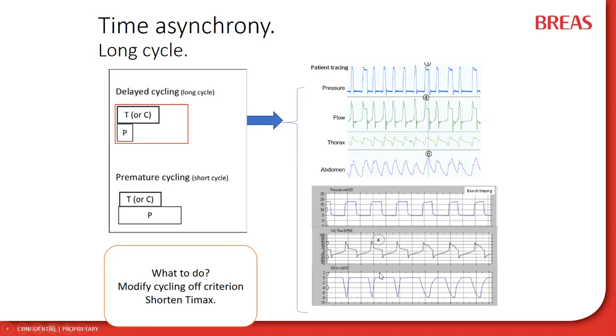You can see here, this short effort corresponds to this double time constant in the inspiratory phase of this cycle. The first part belonging to the effort is faster than the second one, that is slower.